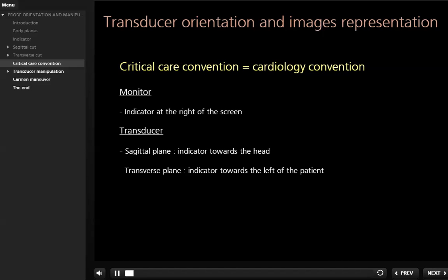To avoid changing the position of the indicator on the screen, intensivists and emergency physicians may choose cardiologist convention. This makes sense as heart anatomy is more complex than anatomy of other organs. This choice may, however, disrupt the radiologist when you show him the sagittal views.